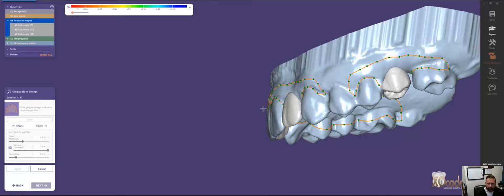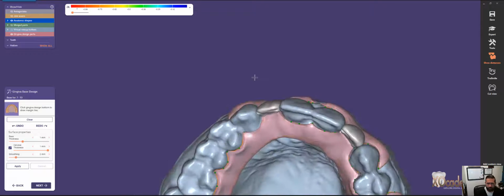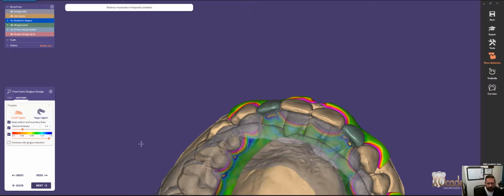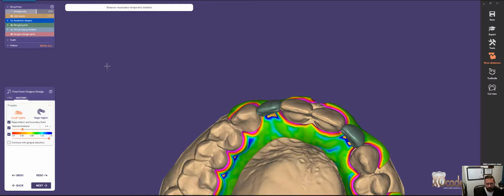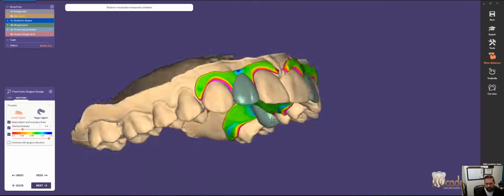So now what we're going to do is we're going to adapt these here. Let me just kind of shape these up a bit here.